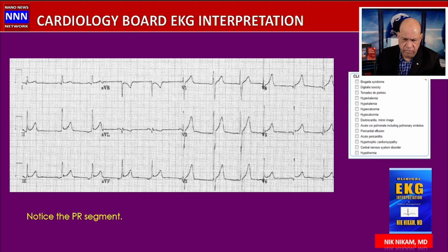And here's an example of what I was talking to you about earlier. A 40-year-old person with hypertension who comes here and you do this electrocardiogram and say, oh, should I call the ambulance? I see ST elevation here. Oh my God, 1 millimeter ST elevation, more than 2 leads. Oh, here inferior leads, ST elevation, anterior lateral leads, chest elevation, 911. No, hold on. Don't call 911. This is a normal variation. It's called early repolarization, which is commonly seen in young people, especially African American males, without any history, or they may have some mild hypertension.